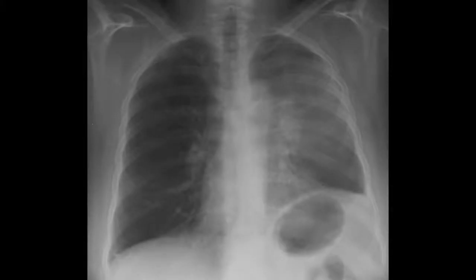The appearance of the collapsed left upper lobe is entirely different to that seen on the right. The lung collapses anteriorly like a plate against the anterior chest wall. On the AP film, this appears like haziness overlying the entire lung. This again highlights the importance of looking for evidence of loss of lung volume on the film.